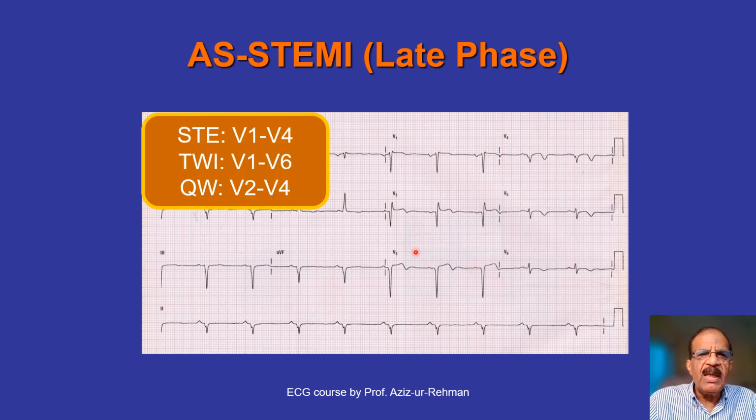and late phase of myocardial infarction is diagnosed on the basis of ST segment elevation, in this case V1 to V4, T wave inversion, in this case V1 to V6, and Q waves, in this case V2 to V4. So we will see these changes in those leads which represent that part, and we are discussing in this module the anteroseptal or the anterior wall. It is actually anterior wall, not just the anteroseptal. Anterior wall myocardial infarction, because in this case it is the whole anterior wall.